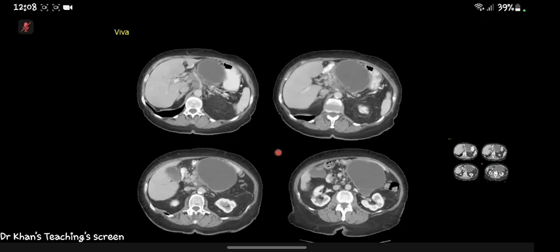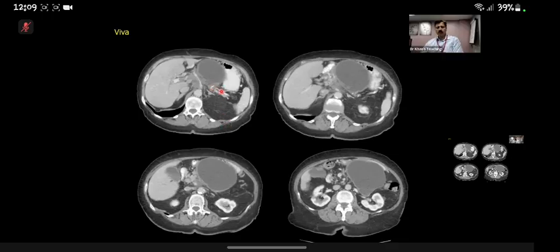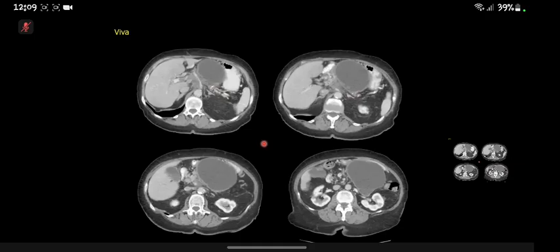Okay, so this is a portovenous CT of the upper abdomen. There is a well-defined cystic lesion arising from the pancreas with a slightly irregular border. The lesion is homogeneous, well-defined. There appears to be some calcification posterior to the lesion. That was in the vessel, so arterial. Don't worry about that. The mass appears to be causing some local mass effect on the stomach, and there also appears to be thrombus in the main portal vein.